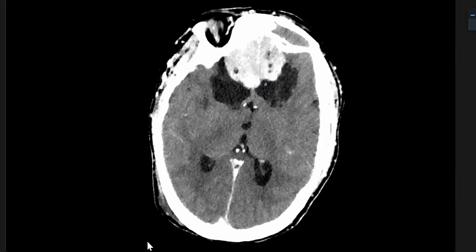So this patient needs urgent neurosurgical review, and might need an MRI brain also according to the patient's condition. This patient needs to be discussed in the neuro MDT as well, and further CT chest, abdomen, pelvis for staging. Okay. Thank you. So you have given me the differentials of lymphoma, glioblastoma multiforme, aggressive mass lesion, and necrotizing mass, basically.